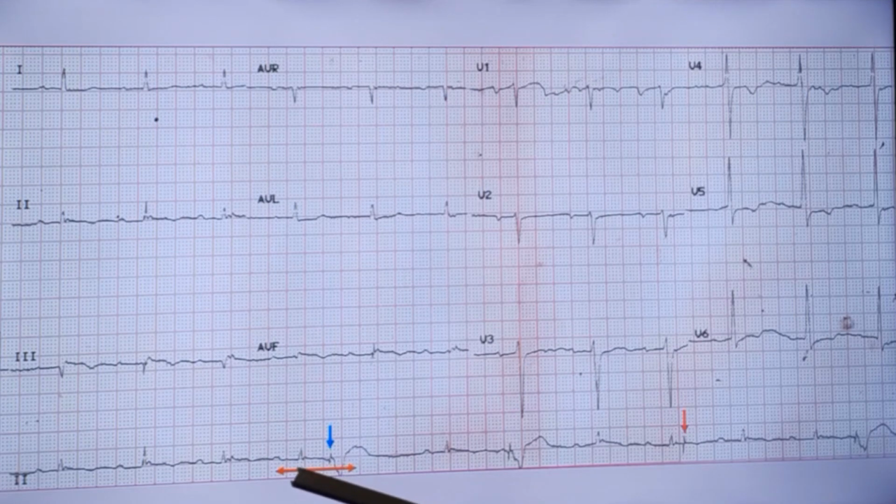And you can also see the second P wave here. This is the first P wave before the QRS, and there is probably another P wave here. That's why I have marked the interval. I have taken the PP interval from other regions and marked it here so that you know where the next P is supposed to come. This is a deformity on the ascending limb of the T wave of the paced QRS complex. You can compare with this. There is not much deformity of this ascending limb, or better this.